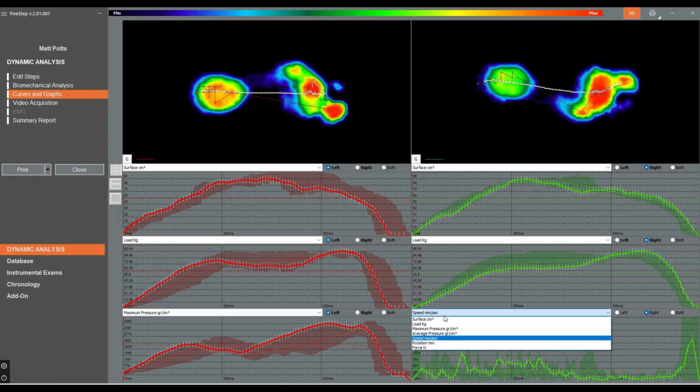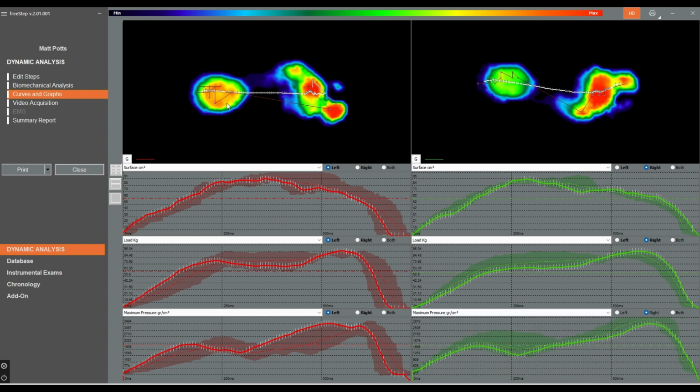I know I'm stating the obvious, but this is a training video. So we're still using those two footprints that we utilized. A quick way of looking at this is the red line is what happened, and the shaded area is the deviation across the other footprints. So effectively this is the data from the footprint, and this is the range around that. It's given us an idea that we've picked two good footprints because it's a nice range within the center of most of the other footprints.